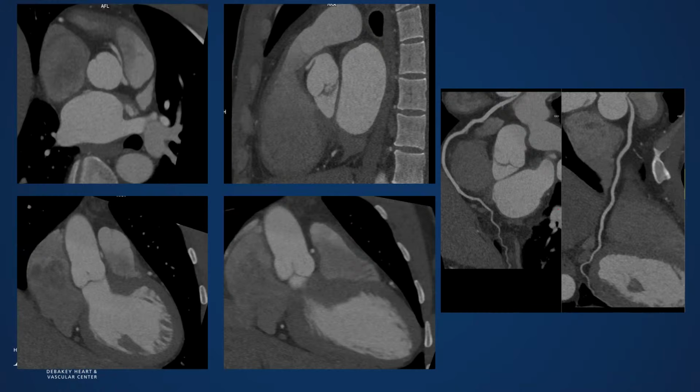As you see here, this is the pulmonary artery and this is the aorta. Sorry, Hatice, you might want to move the mouse cursor to the left of the screen to show the audience. Okay. How can I do that? Move it as if you're having a third monitor.